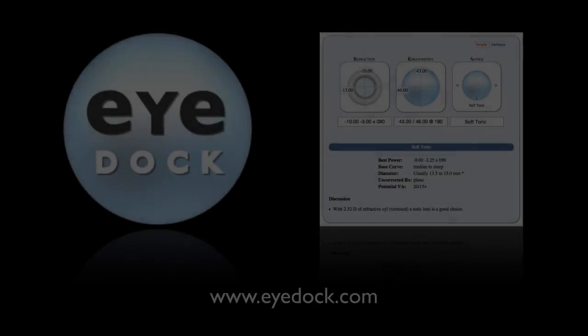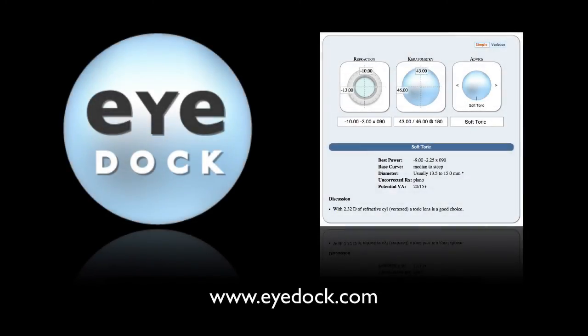A lot of stuff here, and you may use some of it, you may use all of it, you may use very little of it, but I'm hoping that this will be really helpful for people at all levels of contact lens fitting. Hoping it's really educational for students, and bottom line is I hope you get a lot of use out of it and that it helps you in your practice.